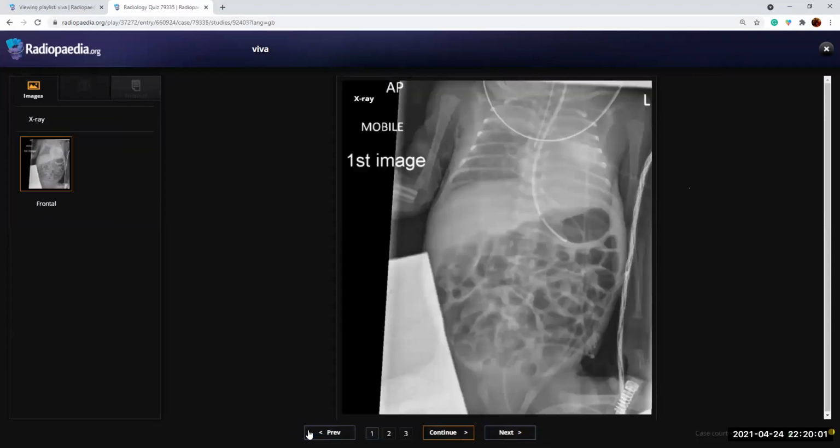Okay, so this is the endotracheal tube, which has been advanced too much. So the left lung and the right upper lobe have collapsed, because there's selective aeration of the lower lobe and the mid-zone, the middle lobe and the lower lobe. So the rest of the things have collapsed. So the left lung was also collapsed. You should have picked it up earlier, but otherwise it was okay.